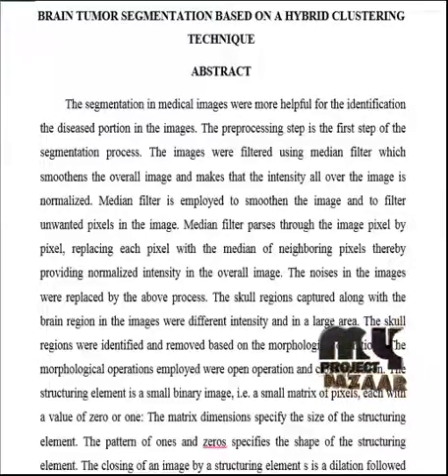The image pixels surrounding the tumor pixels that have similar values nearby the regions were grouped. Contours were extracted around the detected regions. The process is repeated till the boundary of the detected region is within the input region. The final result obtained is a segmented tumor portion.